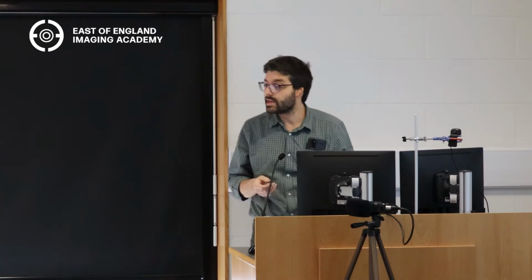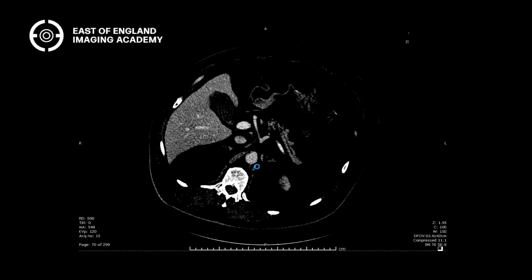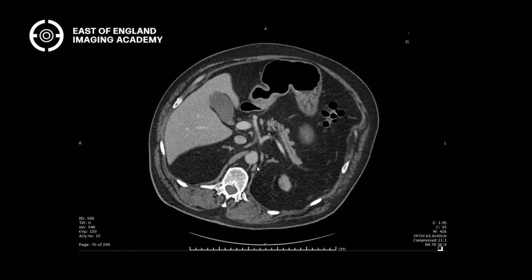So what you do is you group your Hounsfield units into 30 different shades of grey, right? So that your eyes can actually appreciate the differences between these tissues. And the way that you group those Hounsfield units determines what your window looks like. So when I'm changing this, doing different windows, I'm not actually changing the Hounsfield unit values. Those are set. All I'm doing is changing the way that that's distributed, right? So if your greys from black to white are focused in on the range where soft tissues are, so minus 100 to plus 100 or something like that, then you get something like an abdominal window.